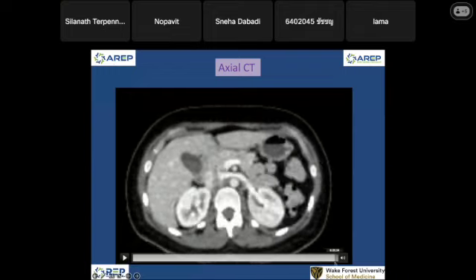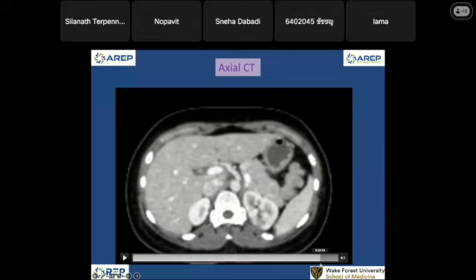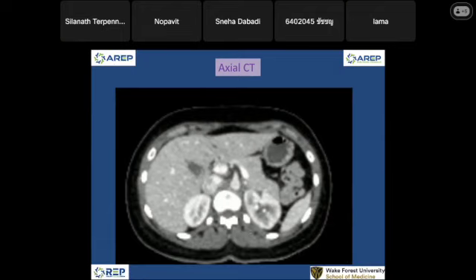And okay, look at the vascular again. So for the vascular, this is the abdominal aorta. This is the celiac trunk. The celiac trunk is supplying the liver and the spleen and the stomach. So this is my celiac trunk, and this is the superior mesenteric artery. This is the splenic vein. Okay, all right, that is the raw data from the axial scan of CT anatomy.